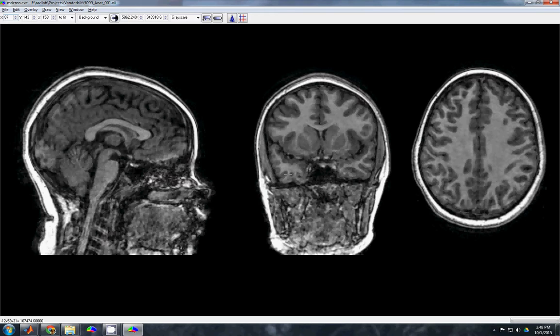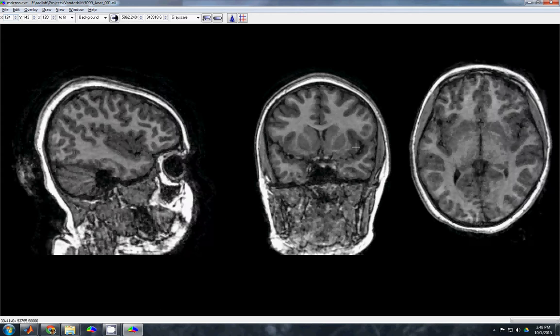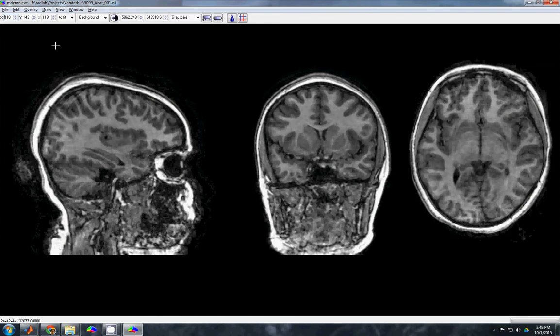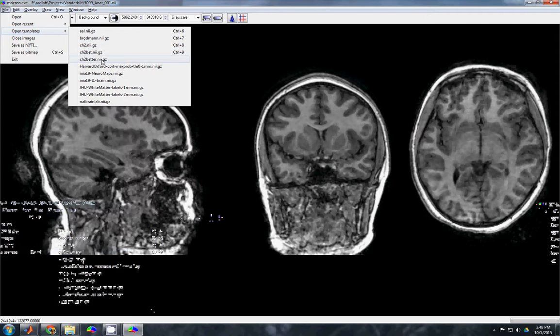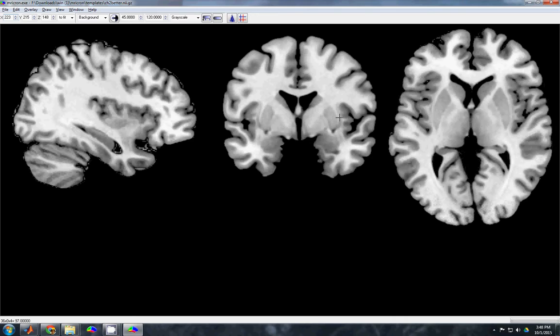It's important for us to discuss a little bit around what we're trying to do in this series. So the point of this study is to be able to map out the structure of a part of the brain known as the insula, which represents, here I'll open the standard brain because it's a little easier to see, information in the back of the insula. So the insula here is this structure running all along here. At the back of the insula, we get information from what's happening in our body from moment to moment. It could be from the breath or heartbeat or feeling hot or cold or pain or pleasure. And that information slowly moves forward and gets integrated with other types of mental representations.